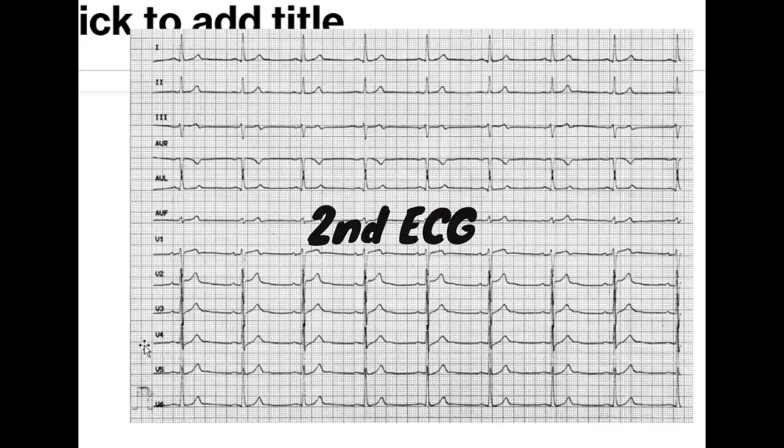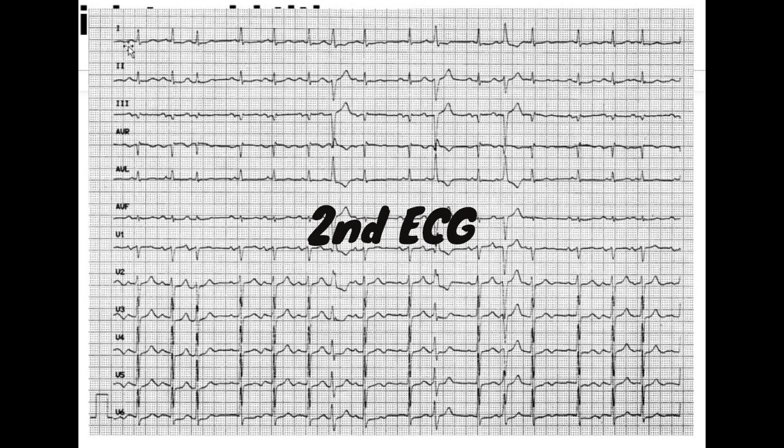This is the second ECG. And for this one, the action is actually irregular. And if you take a look at the entire ECG on a broader view, not focusing on each individual lead, you can see that the reason why it's irregular is because there are 3 extrasystoles. So it's irregular. The rhythm is, however, sinus because each normal QRS complex, I don't mean the extrasystoles, but normal QRS complexes, are preceded by a P wave, and the heart rate in this case is 96 beats per minute. So there is some sort of tachycardia. So the diagnosis in this case is sinus tachycardia with extrasystole.